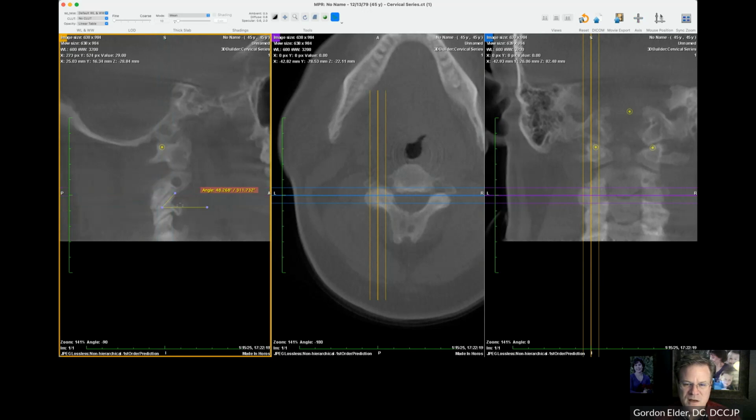But you can see his, compared to the ground, C2-3 on the left is angled at 48 degrees anterior superiorly. Okay, we'll measure this one down here too. I'm just going to do a copy paste so that I don't have to re-measure to the ground. Boom.